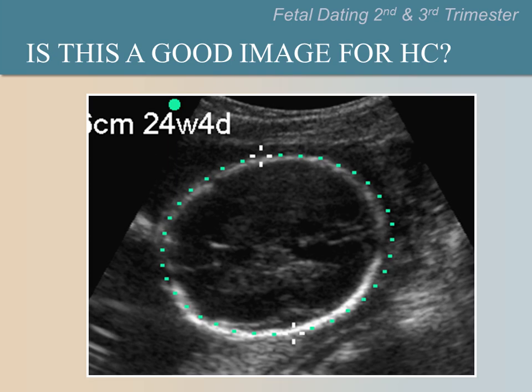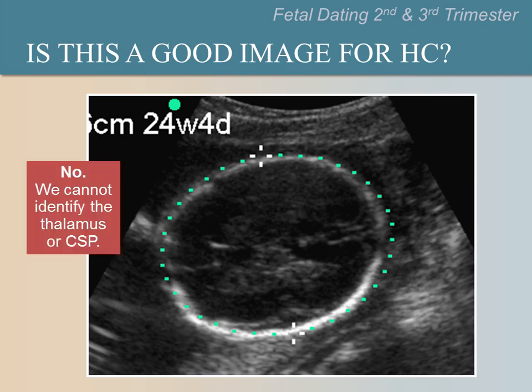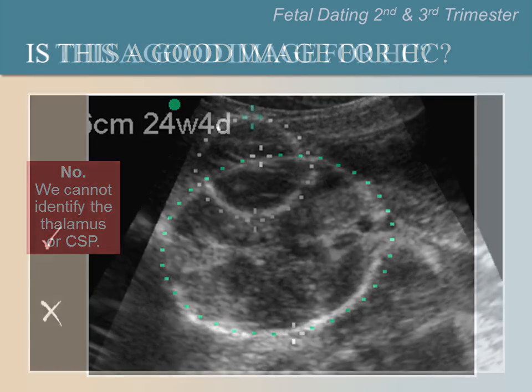Is this a good image to measure a head circumference? Why or why not? Please pause the video now to encourage responses from the group. The answer is no, because we cannot identify the thalamus or CSP.